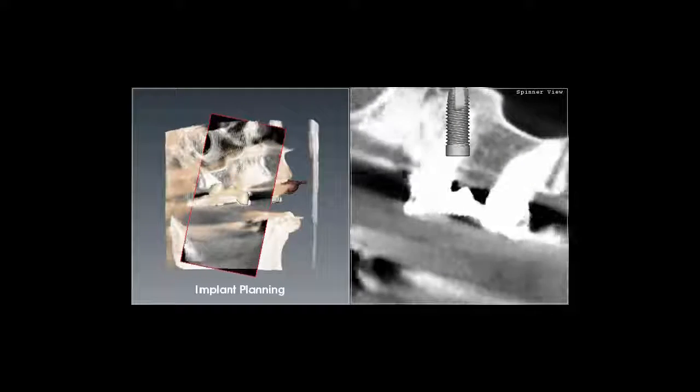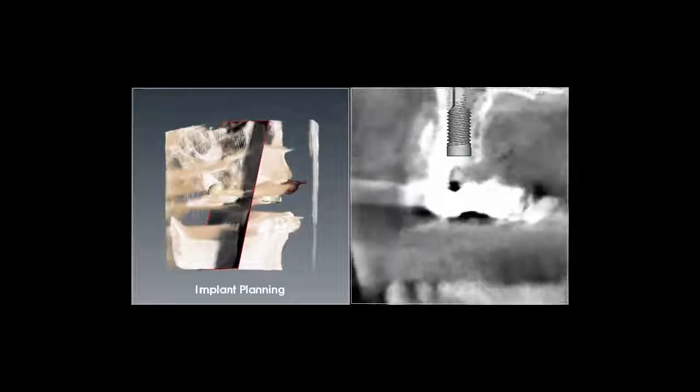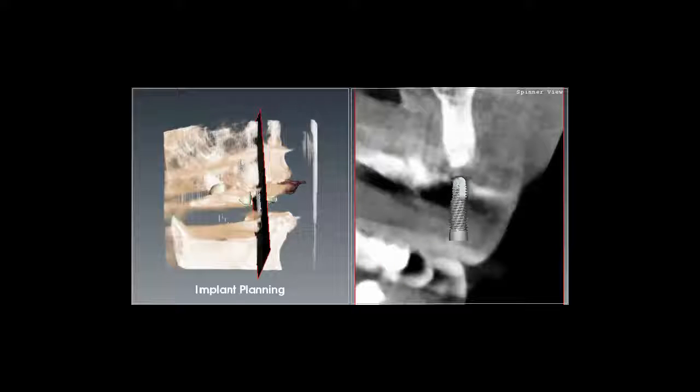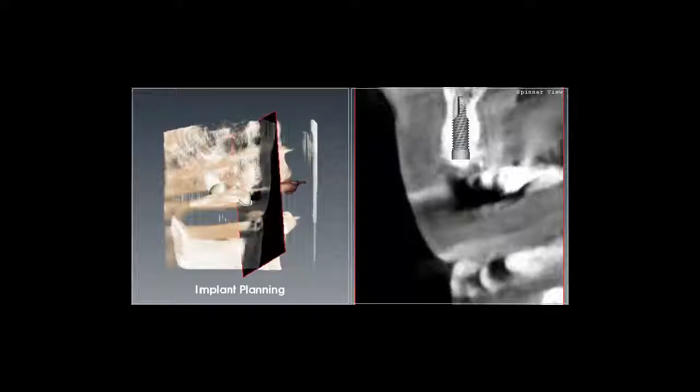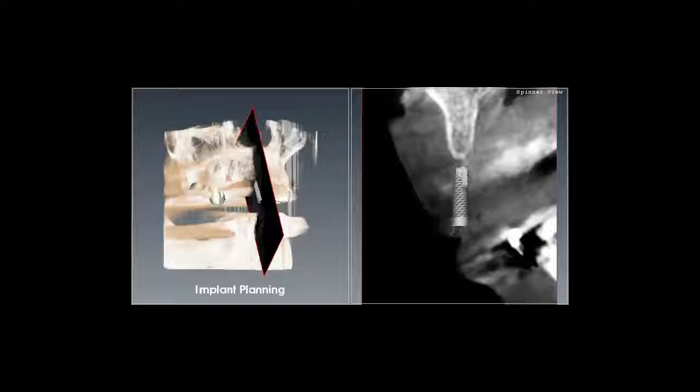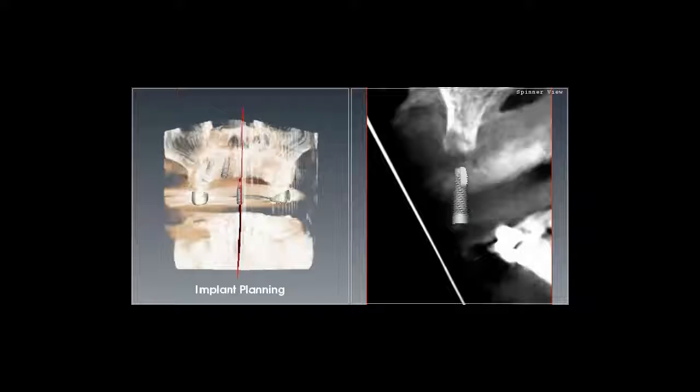So it would be recommended to extract tooth number 4 and place an implant in 3, and then proceed and do the tripodization to maximize the implants, so that in the future, if the patient loses the 2 molars that are left behind, there will be no need to place any more implants or replace the framework and the teeth that will be reconstructed for her. So we are planning for failure up front, so we can move forward and place enough implants now so that in the future patient doesn't have to go through another procedure to get more implants done.